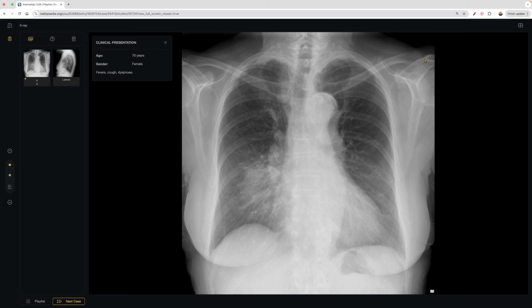We look at the clavicles, going across, nothing here, coming down, going back up, going across. This lung looks pretty fine. And then we come across here. The costophrenic angle is not blunted, and that's what a pleural effusion would look like. We'll see that later. And as we go across here, we see that there is some opacity.